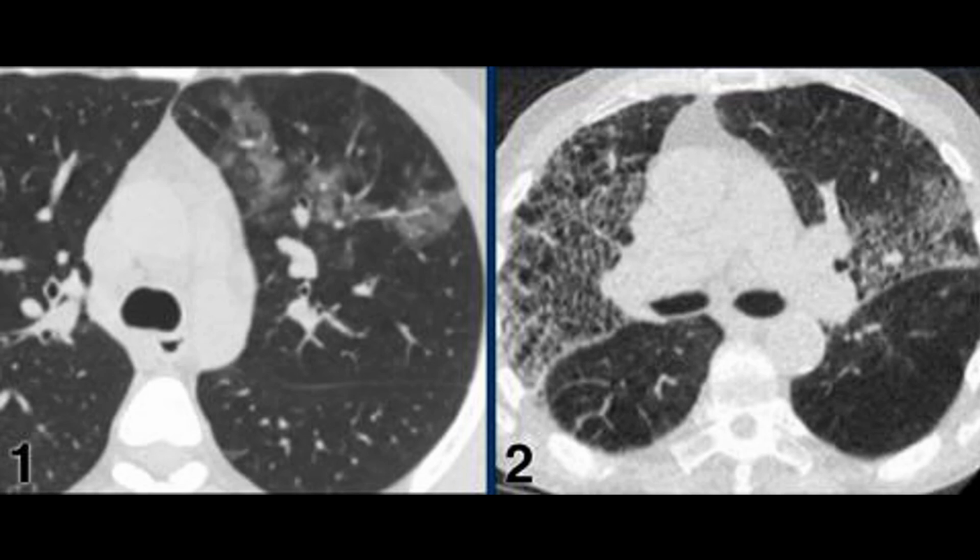And so this is an example. You can see there is multifocal ground glass opacity, but this is only unilateral involvement. In this image, there is extensive emphysematous change, but here there is a crazy paving pattern, or septal thickening along with the ground glass opacities. Now this is a case of COVID. It looks like bilateral involvement, ground glass opacity, septal thickening, but underlying emphysematous change is present. So there is some pre-existing disease present. That's when either there is pre-existing disease, or there are some changes which are not fitting in CO-RADS 5.